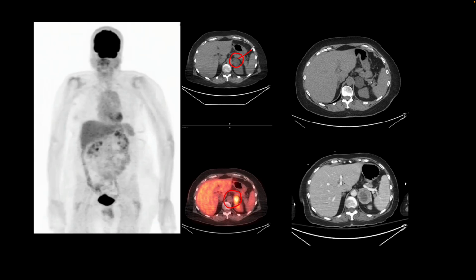It was minus 2.5, and so the specificity of calling an adrenal nodular mass an adenoma or a benign adenoma is very high when their attenuation on a non-contrast enhanced CT is less than 10 Hounsfield units, and that's what this case was.